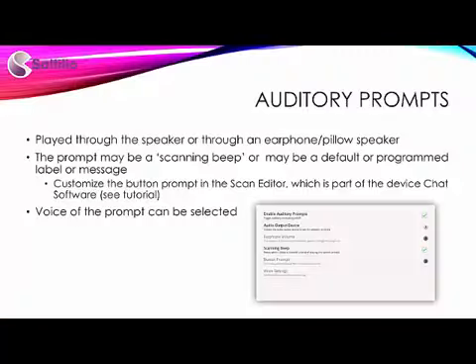Next, I will discuss auditory prompts. Does a client need auditory prompts? Are they visually impaired? Do they perform optimally with auditory feedback as well as visual feedback? If yes, then auditory prompts might be a fit. The chat software offers customization of how the prompts are heard.